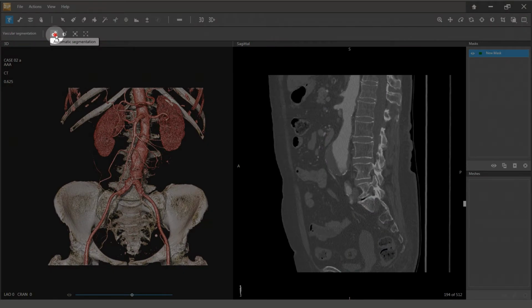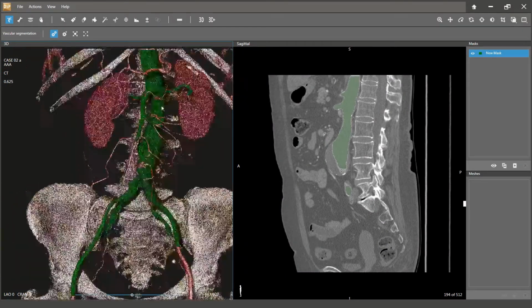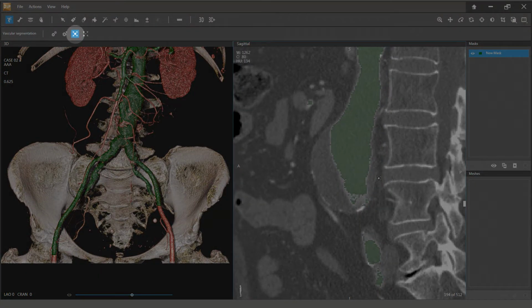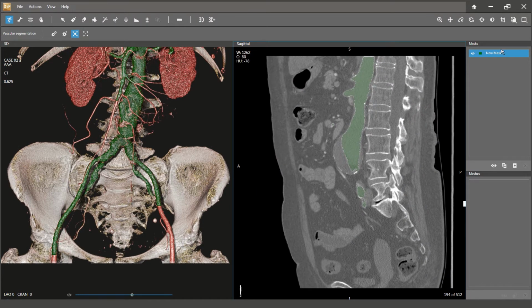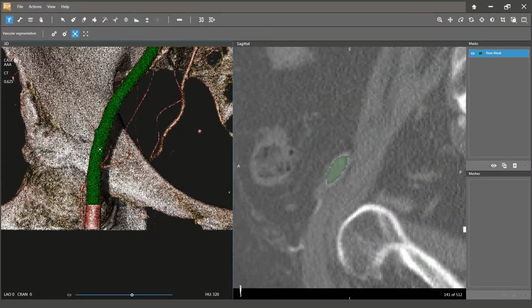Select the normal auto segmentation tool to segment a vessel within the entire volume. Select the normal path tracking tool to expand vessel segmentation in constant steps of up to 40 slices in each direction. You may continue to click and drag the mouse cursor along the vessel's path you wish to segment until it is completely extended, or click a part of the path until it completely extends.